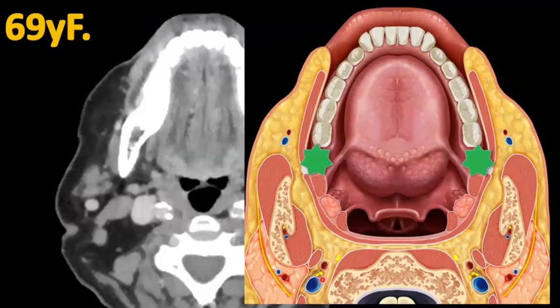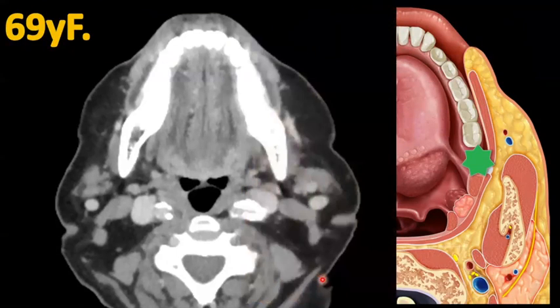So these are really interesting tumors because I think these can grow extraordinarily large before people can see them on imaging, and it's a great place if you ever want to hide a tumor on a head and neck scan. You put it in the retromolar trigone. It's very easy to hide them here. So this is a patient who has an RMT tumor, and I've told you they have one, so I'm hoping that you believe me. But this is insanely subtle, even with a pretty decent contrast enhanced study here. But you can see this very subtle asymmetry of fat.